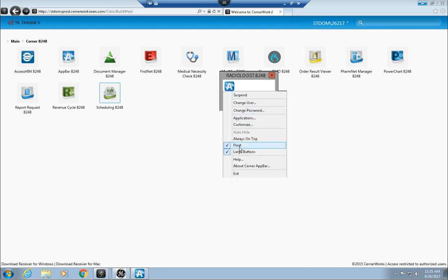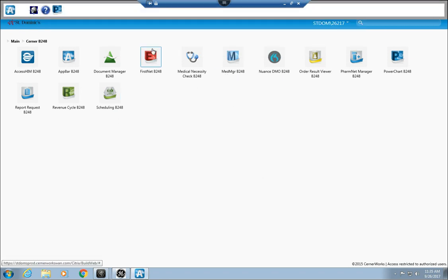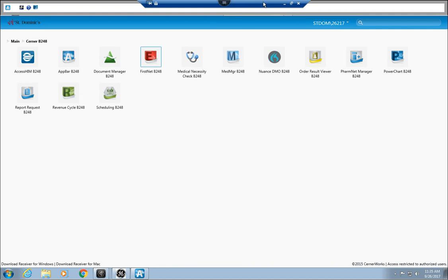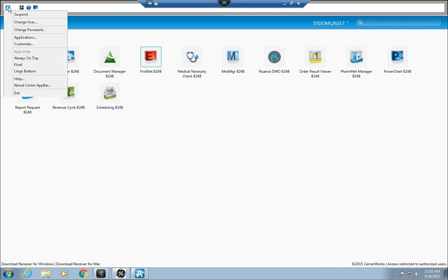taskbar. Now, what you'll actually see when you use it for the very first time is a very different view. It will look a lot like this. You'll have a bar at the top of your screen, and you'll have this little A in the far left-hand corner, and that's about all you're going to see. So what you'll want to do to set up your other icons that you need here is to left-click it. Actually, you do a left click, not a right.